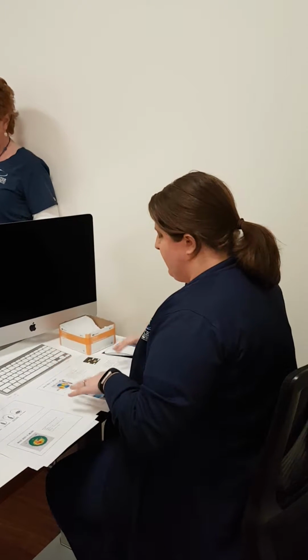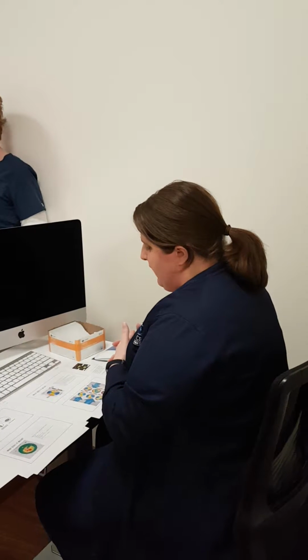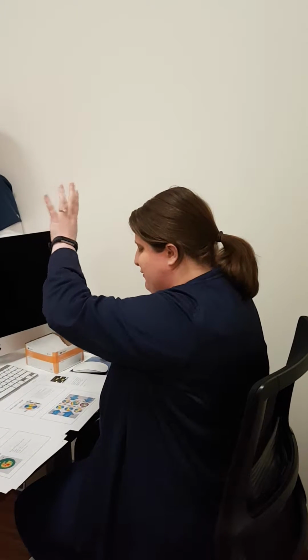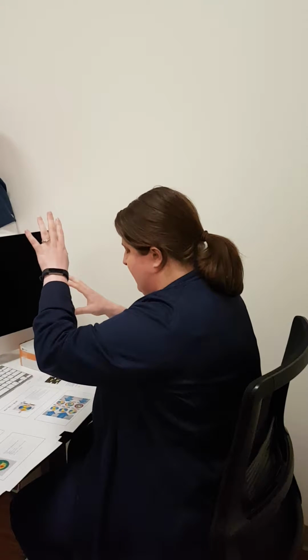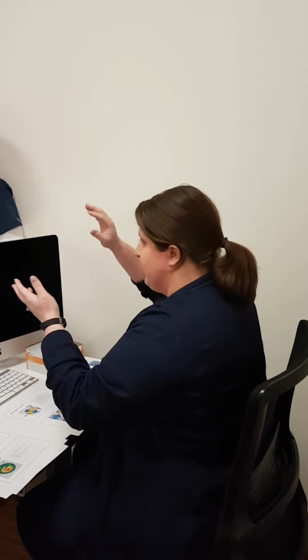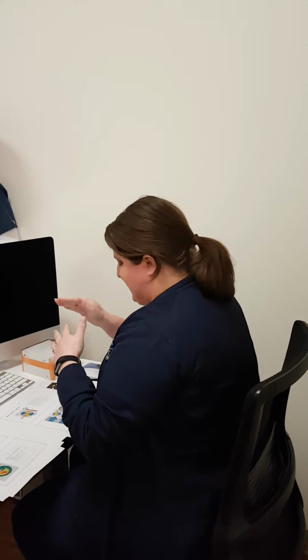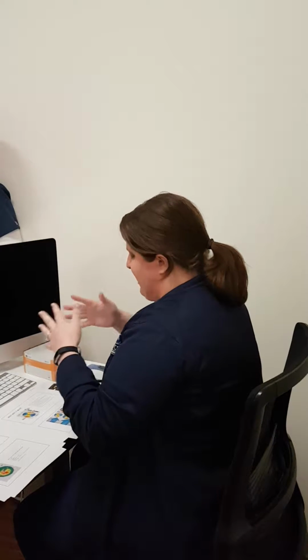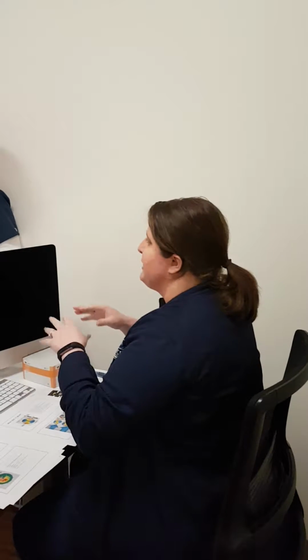Abnormal shapes in the slide below can be islands of depression, islands of elevation, and kind of, again, wonky. They call them tongue-like projections. Just not normal looking hourglass shapes is what you're looking for in an irregular cornea.